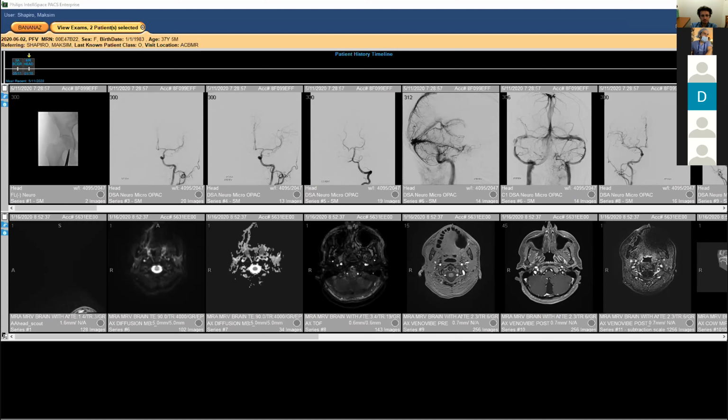So the difference is between a normal vein of the tentorium, the meningeal vein, and a sinus, which you could give more importance, something which collects multiple veins. These are just veins going towards the sinus, and at a certain point they enter the dura like most cerebral veins do before entering a sinus. That's just to keep things simple.